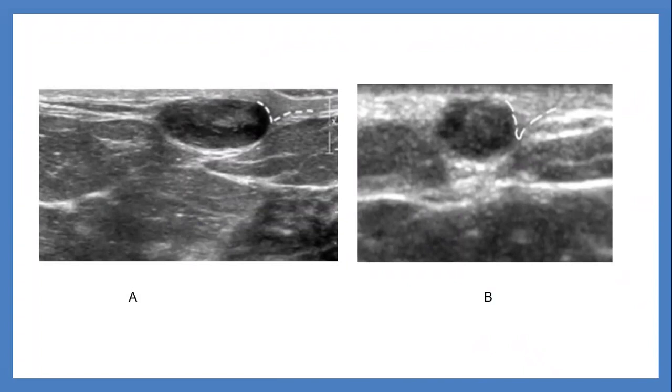If I ask you about this lesion, is it hypodermal or dermal? Hint. Dermal. It is dermal. Why? Because the angle is acute. This sign is called the claw sign.